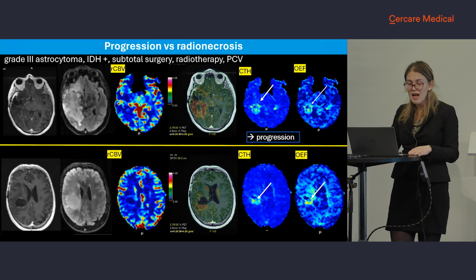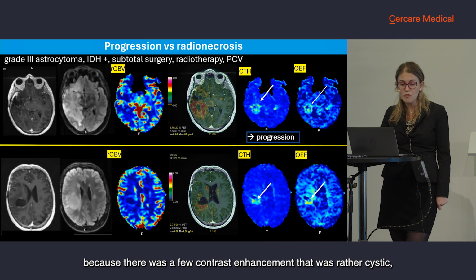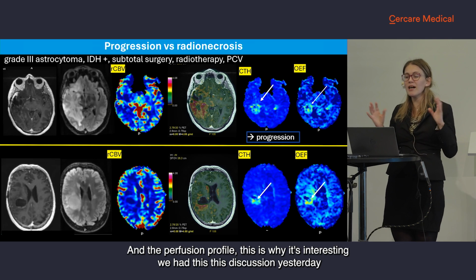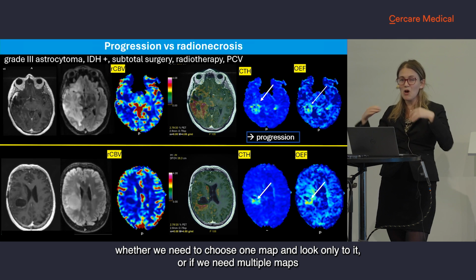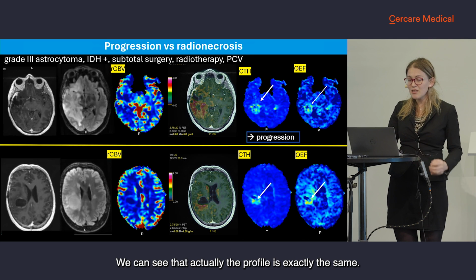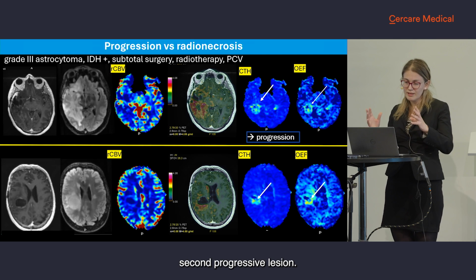It was confirmed. But what was most interesting is that there was this second lesion that was considered to be radionecrosis because there was little contrast enhancement. It was very cystic. But still there was some PET DOPA increased uptake here. And the perfusion profile, this is why it's interesting. We had this discussion yesterday whether we need to choose one map and look only at it or if we need multiple maps. I think that for complicated cases we need multiple maps, because looking at multiple maps, we can see that actually the profile is exactly the same. And obviously it was also a second progressive lesion.